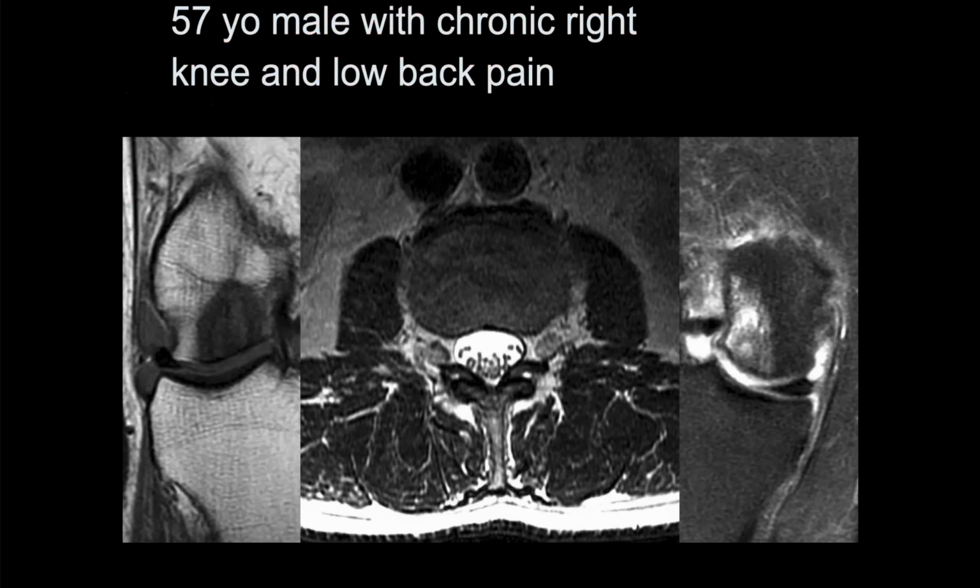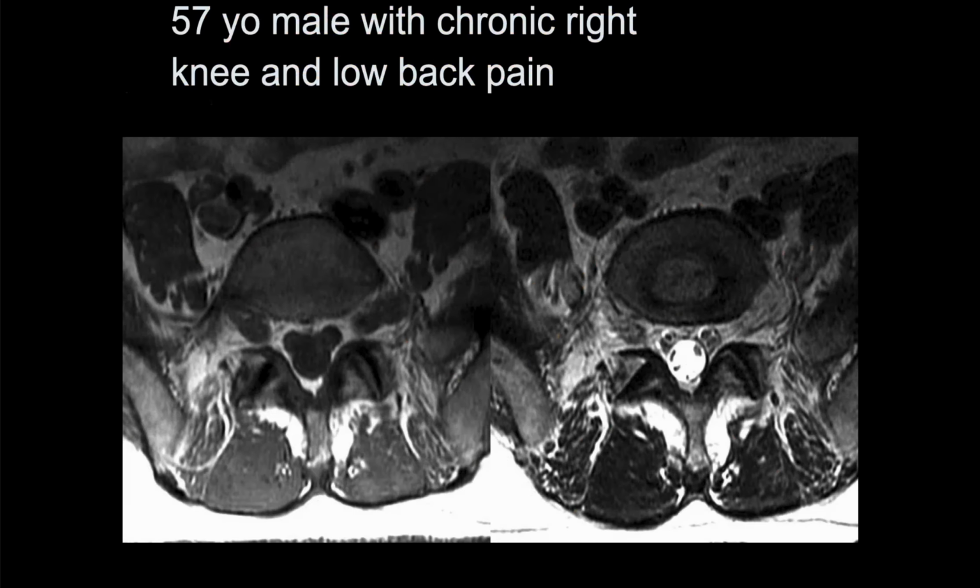Here's what the lumbar spine study shows. Yeah, those nerve roots look thick and edematous. These are probably okay. The ones in the foramen though don't look like it. We go farther down. Above they look pretty normal, but now we're seeing that they're thickened on both sides. And look out here how thickened they are. This seemed odd to me, that they were normal inside the cauda, but when they came out, they were thickened.